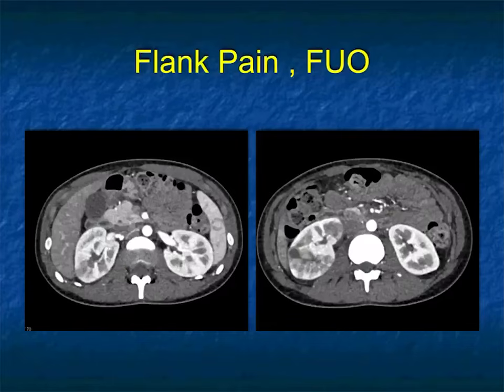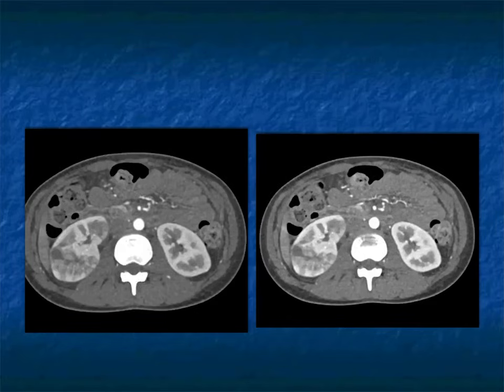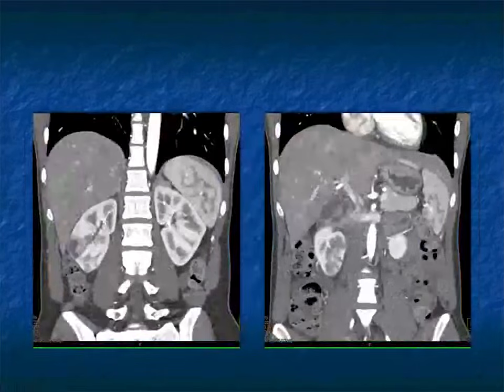Okay, another patient, fever, patchy enhancement right kidney, striated nephrogram. This is the arterial phase. And you can see it again as I widen the window, makes all of these abnormalities at the cortical medullary junction more obvious. You see it here, but look at the normal left kidney, cortical medullary differentiation, looks perfect.